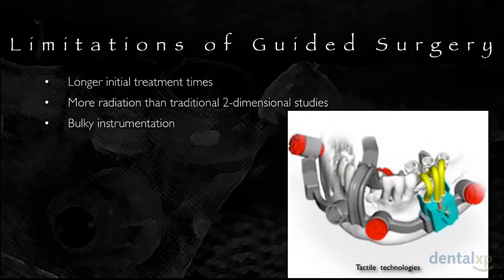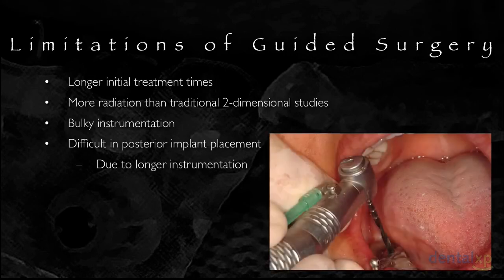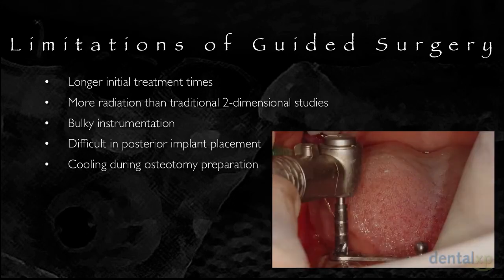In some of the navigation systems, we have very bulky instrumentation, and even with traditional CAD/CAM guided surgery, we could have this longer instrumentation, which makes it difficult for posterior implant placement. But with the understanding of the surgical instrumentation, we can overcome all of these limitations in regards to implant placement in the posterior segments.